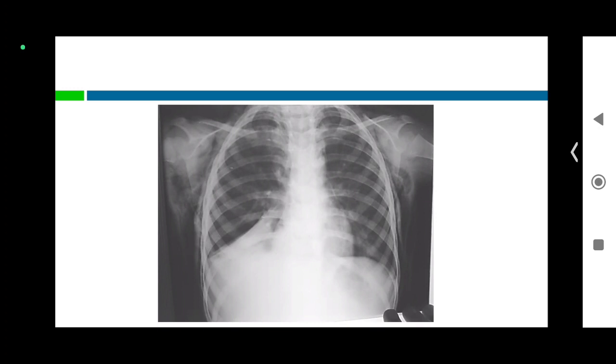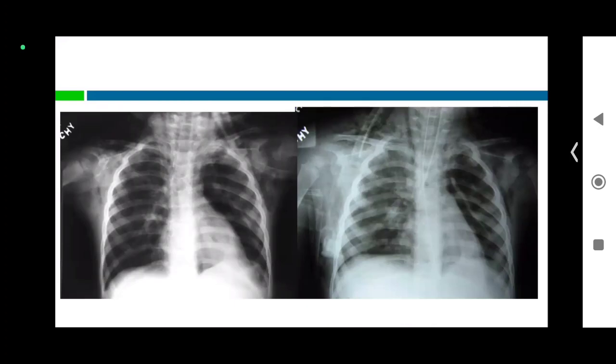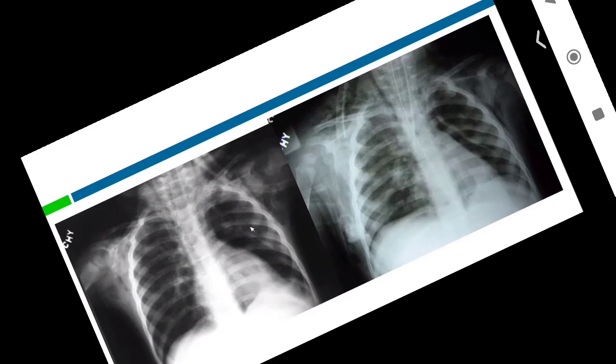Most often it happens after a violent cough, especially in foreign bodies. Okay? The treatment is masterly inactivity. Everything gets absorbed by your blood circulation. Don't do anything. Previously, we used to do a lot of incisions, multiple incisions, but we need not do anything. Okay? Another example of subcutaneous emphysema.